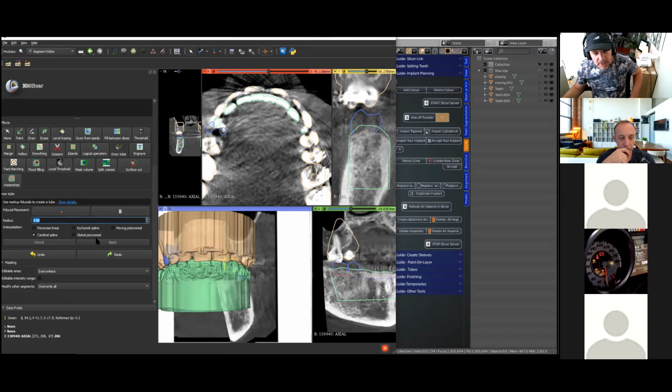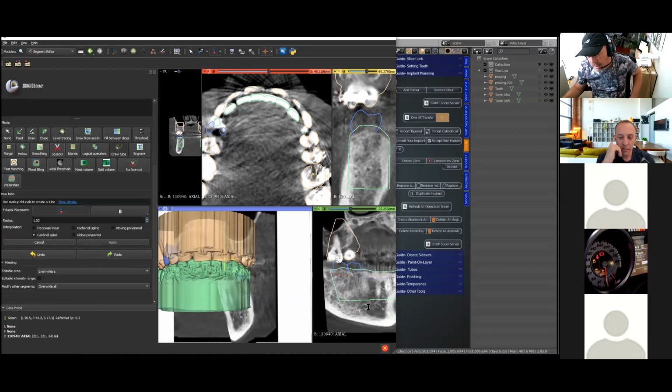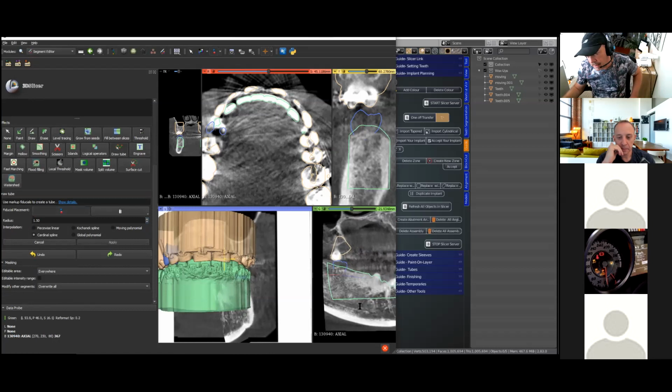So I'm going to click on this and then place it, left click, and move my mouse and find it. Here we go. Place it again, and then just draw this and then right click to get out of it. Then I'm going to apply this and you'll see that it automatically turns into a color. Now this is our segment.